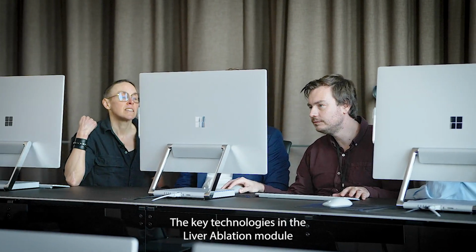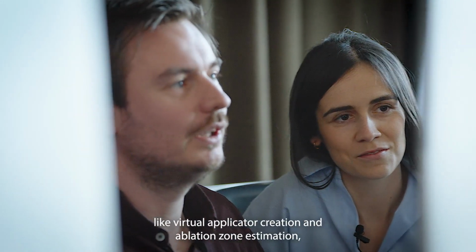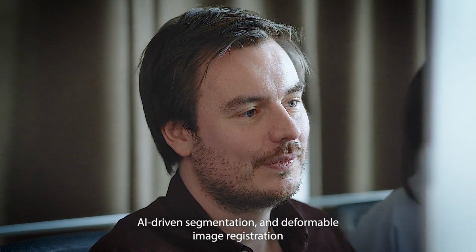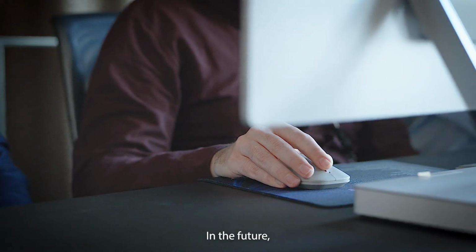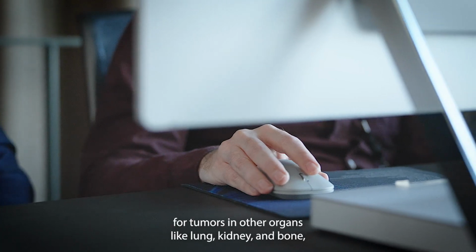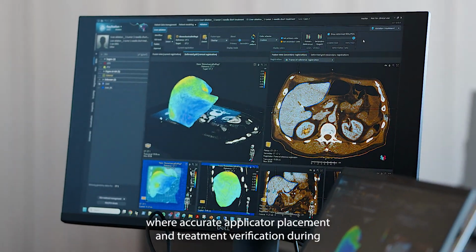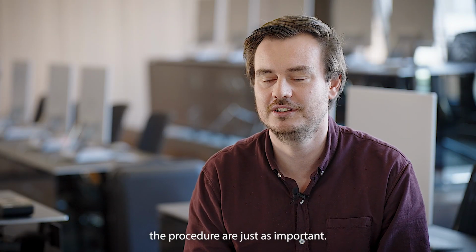The key technologies in the liver ablation module, like virtual applicator creation and ablation zone estimation, AI-driven segmentation and deformable image registration, have great potential beyond just liver ablation. In the future, these technologies will be adapted for fully automatic workflows for tumors in other organs, like lung, kidney, and bone, where accurate applicator placement and treatment verification during the procedure are just as important.